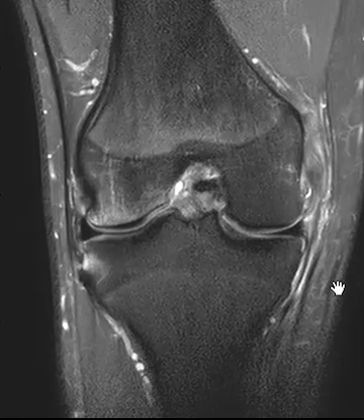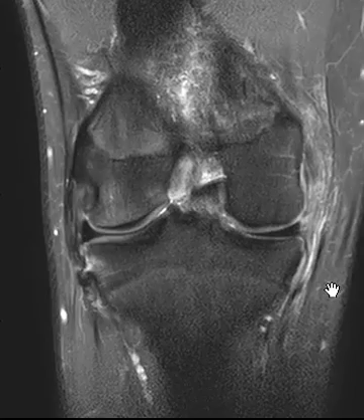And in radiology, you see lots of patterns. This is one of those common patterns. So just with a quick glance, you can tell what's going on. And so here it is.